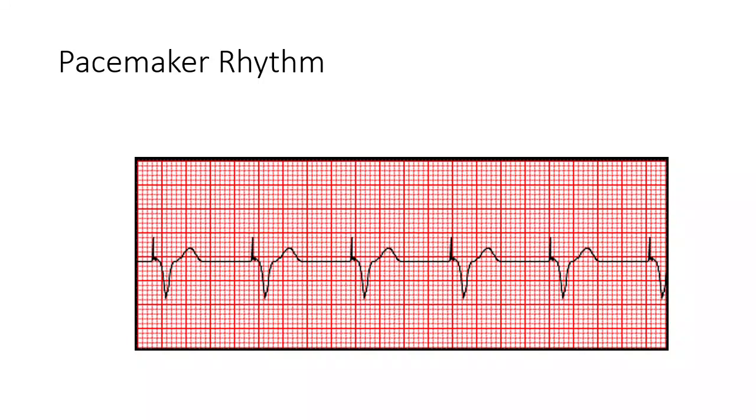Now, we talked about this on Monday. If you wanted bonus points for this, what would you tell me? It's a single chamber? How do you know? Because there's only one spike. Yeah. So there's only one spike. So if you were to say, oh, well, that's a dual chamber, you don't get the extra points, but it's not going to hurt you. Okay. So that's a single chamber pacemaker rhythm. Good. Very good. Bella?